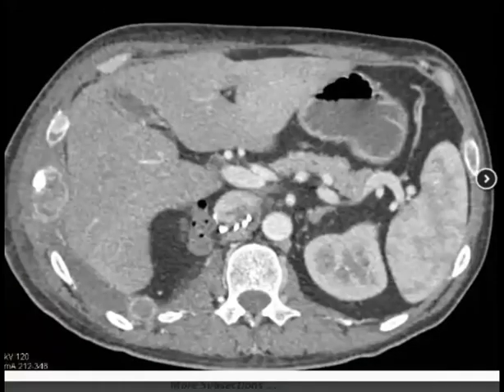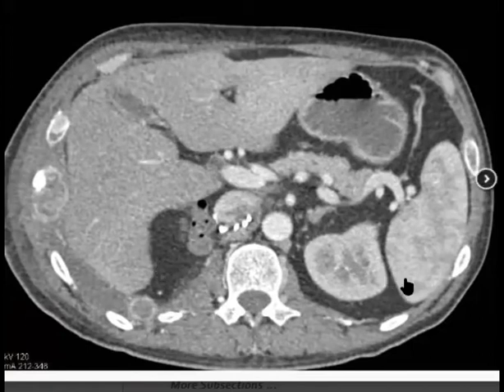But you can imagine there are some surgical sutures here related to the IVC, and you find the left kidney at this level, but you are missing what in the fat of the right kidney? You are missing the right kidney.